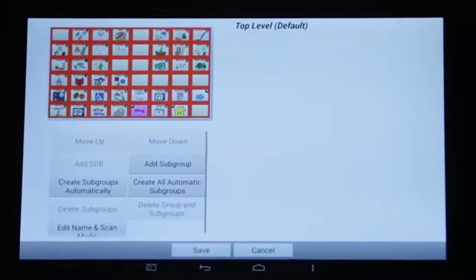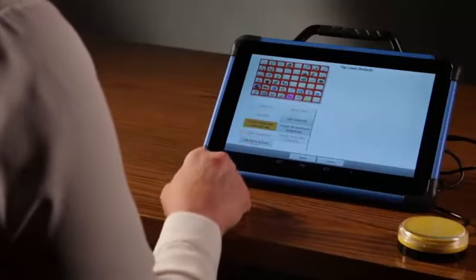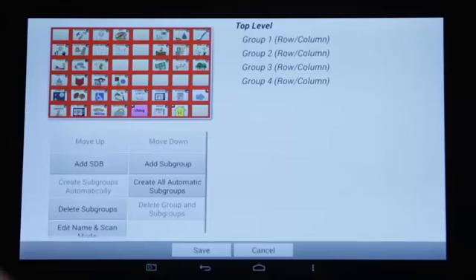A preview of the page appears and I am able to see what areas I am creating the custom scan for. I originally set up the scanning pattern to be block in our settings. In this example, I will create subgroups automatically to allow the software to set up the blocks following the system settings. I will create meaningful new labels for the blocks. 4 groups are created. Each group can be renamed to create a meaningful label, which will be the auditory prompt.